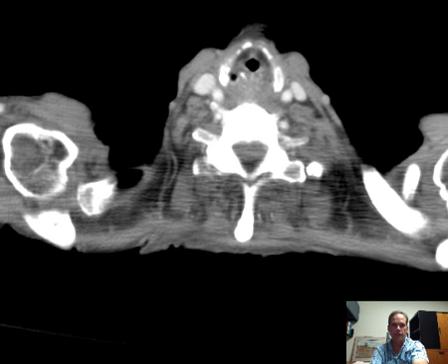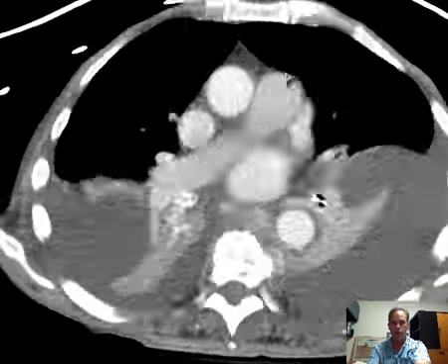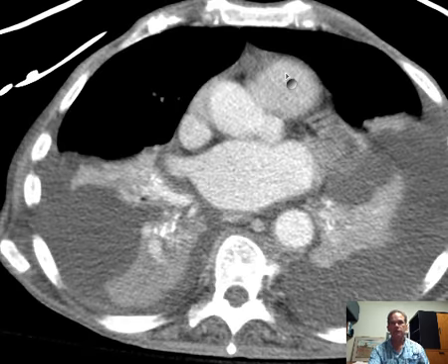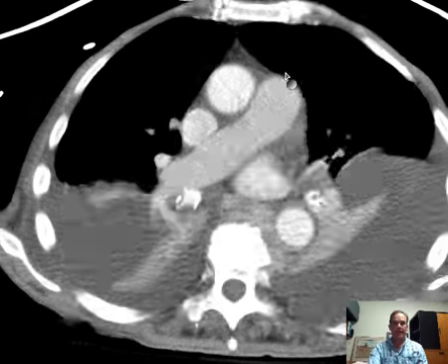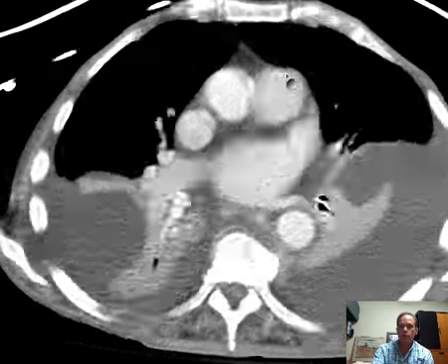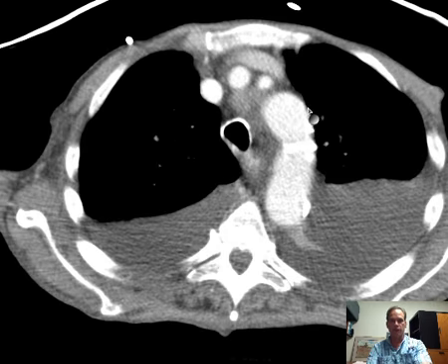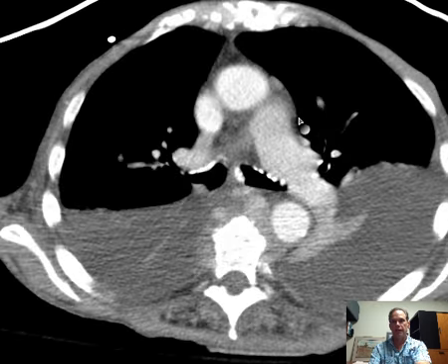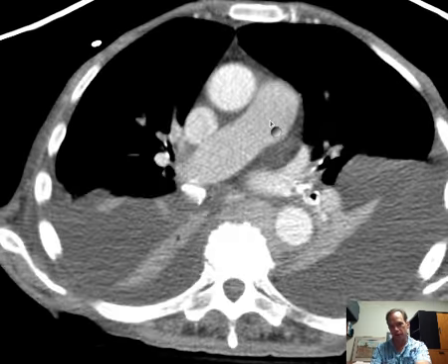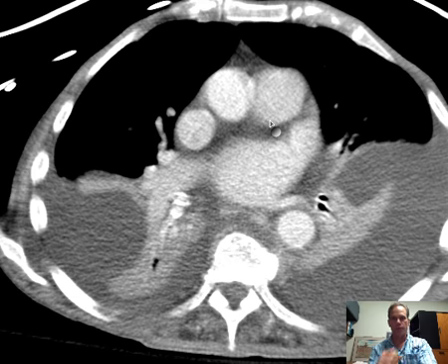Now let's switch gears to the vessels, and we'll look at the vessels of the mediastinum, of which there are two most important arterial vessels, and they are the aorta and the pulmonary artery. Now, most people learn the aorta and the pulmonary artery. They learn the aorta first because everyone knows the aorta because it's a nice little bump on the chest radiograph. And then you kind of have a general vague idea of the pulmonary artery. But the relationship of those two arteries is very important.